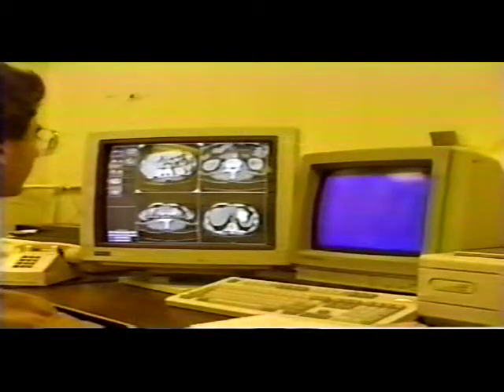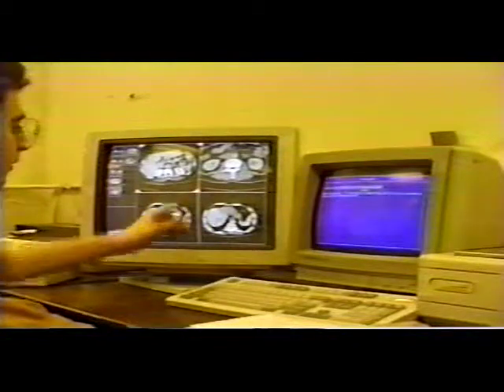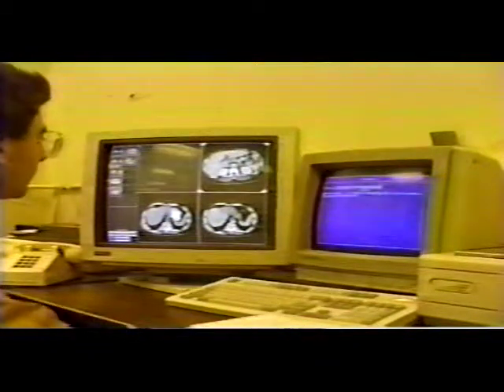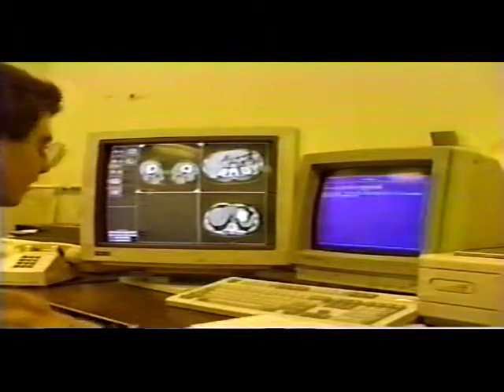If you want to just click on an image, it will display a sequence of them, the current image and all the next ones. You can grab an image and move it like that to make room, or you can have them deleted.